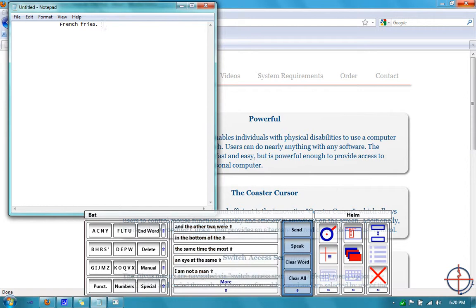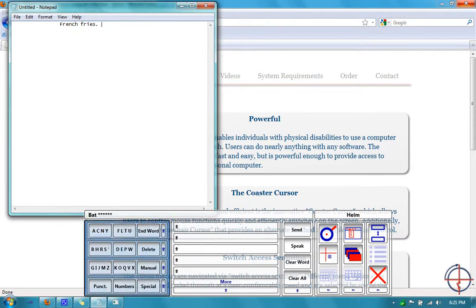Now, not every word is in our dictionary. If you want to enter a word that isn't in our data, for instance, Tilvus. Tilvus is a proper noun, I suppose, but you're not going to find it in a normal dictionary. So he's typing Tilvus. So we type Tilvus out, and you'll notice there are no predictions for it. It doesn't know anything like that.